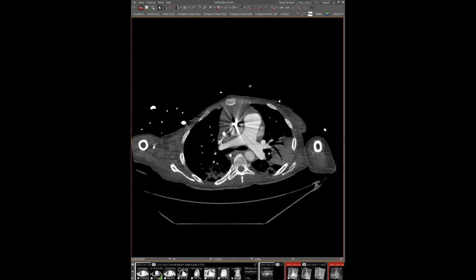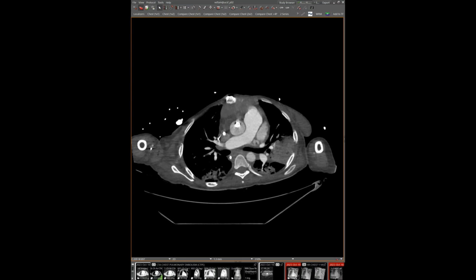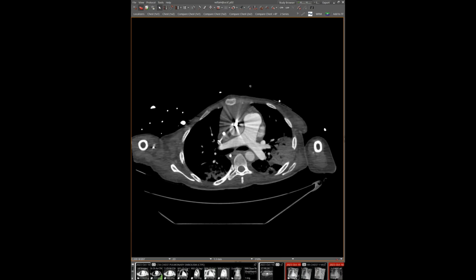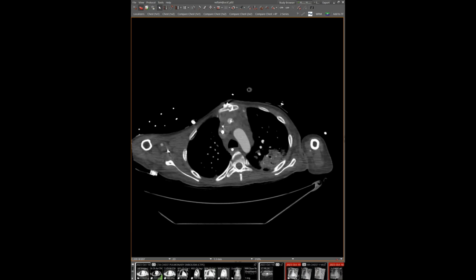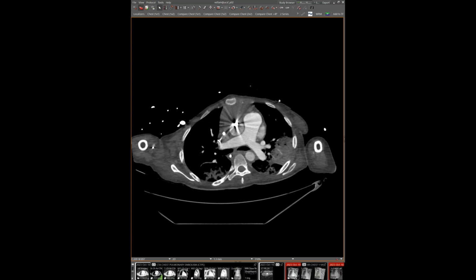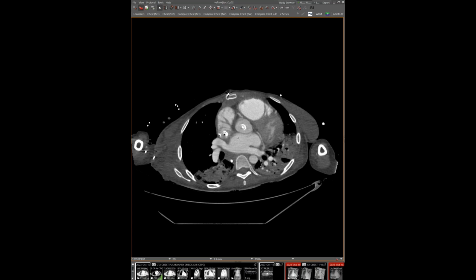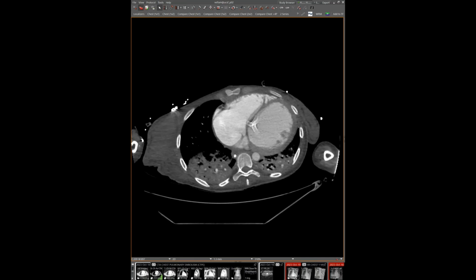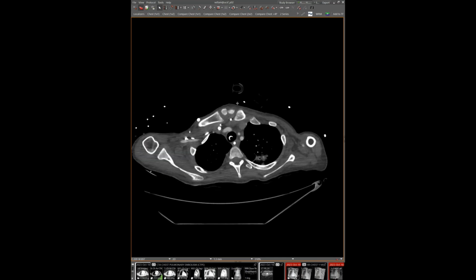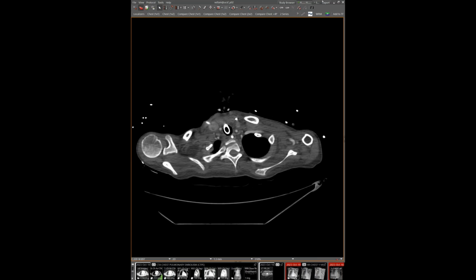And so at that time they decided that the best approach to placing this Impella was by creating this sort of little graft chimney coming off the anterior aorta so that they could place this device directly into the aorta through that. I've not seen that done all that frequently, but it was just an unusual appearance on the CT and the X-ray. Yeah, that's neat. I've seen that on 2 occasions.